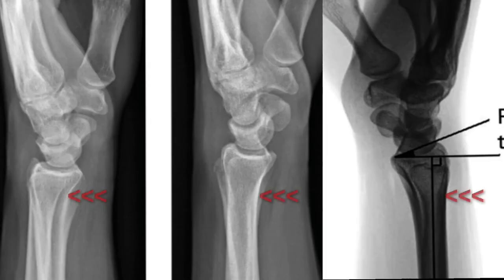The distal radius in the true lateral view, to be acceptable regarding the relation between the ulnar head and the distal radius, should cover more than half of the ulnar head.